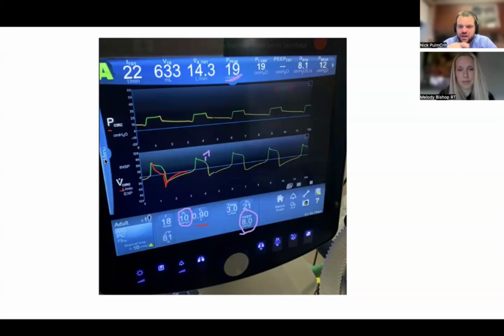So that's what I see: a patient working, getting more flow. I'm thinking in my head, I don't know what the plateau pressure is. So am I worried about a 6 cc per kilogram situation? Because 633 might not be it, number one. Number two, as we talked about before, is there some auto-PEEP? There could be, because the flow doesn't come to baseline in expiration. If I colored in the area under the curve, would the inspiratory limb be bigger? It might be bigger. So that shows me something else.